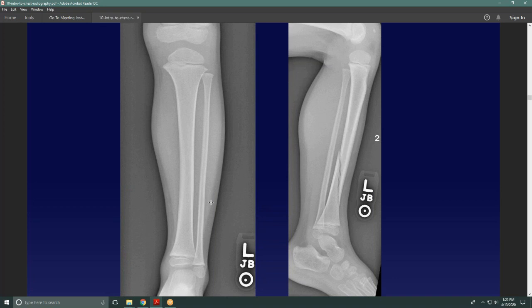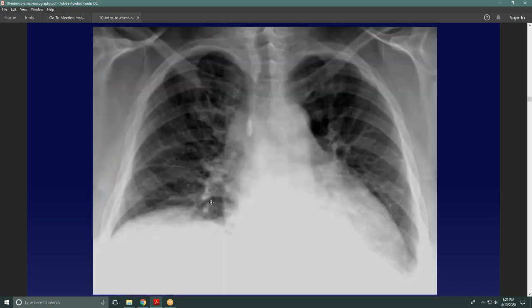And so an example from chest, which is helpful. Look at this little thing right there. Now, what is that? It's kind of in the location where you'd expect to see the azygos arch or the azygos vein, but it's too radiodense. The shape isn't quite right. I mean, did they swallow something? Is that a retained foreign body?